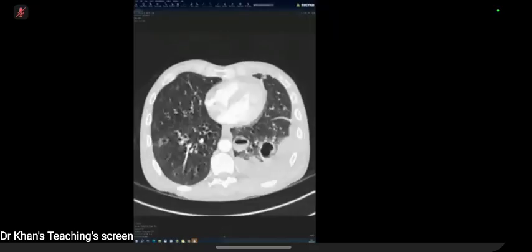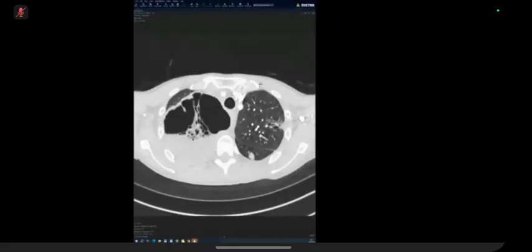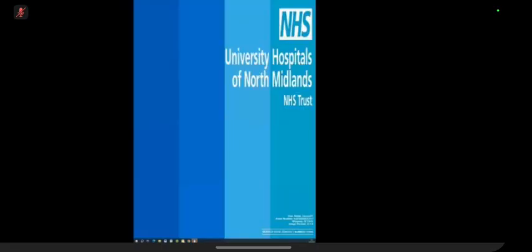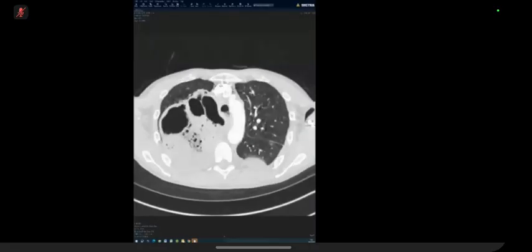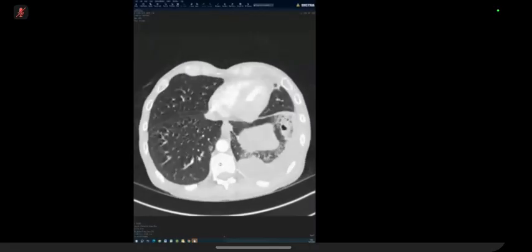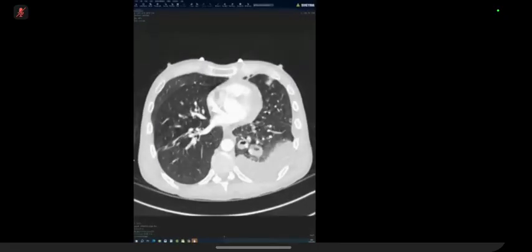On the CT, I mentioned that TB is less likely. I think so on the CT. Yeah. Well done. So there were extra points in there for PE, and for mentioning that this was thin walled and you were not suspicious for cancer. Depending on patient history and symptoms, you would recommend an echo, which may be helpful to look for any cardiac abnormality.